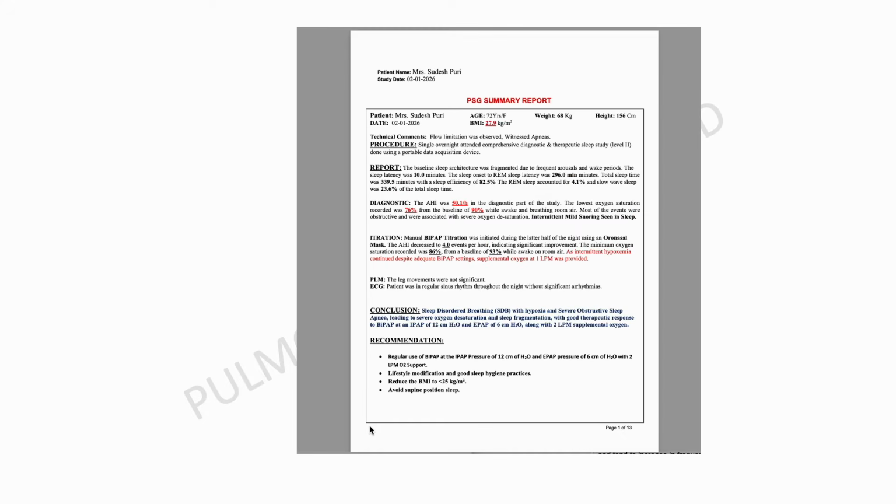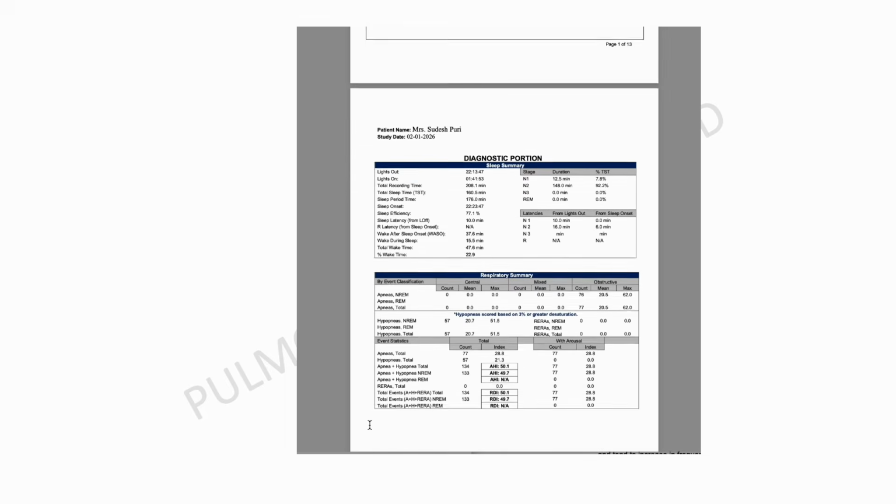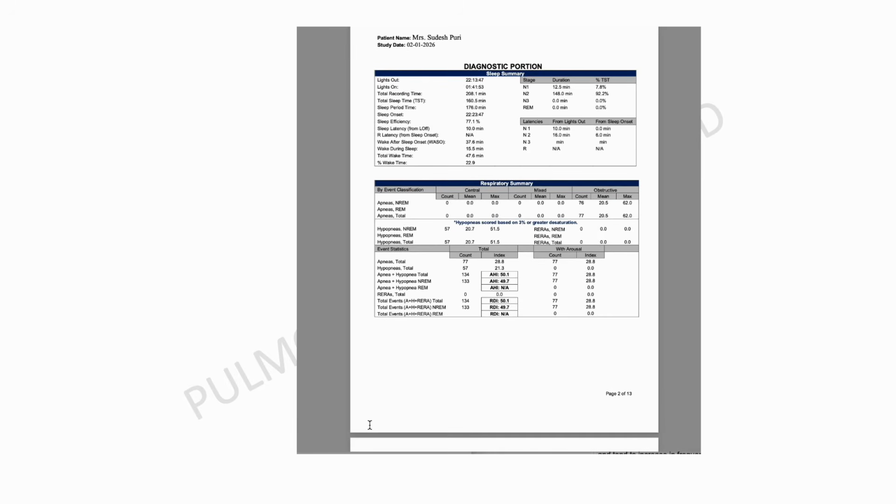Now let me take you through each section of the report, because that's what I'm talking about here: how to look at the report and know what it's dealing with. So this is how a summary report looks, and I'm just going to show this because we'll come back to it, because this is the last thing that we do, after reading the report. This is how the report actually looks.